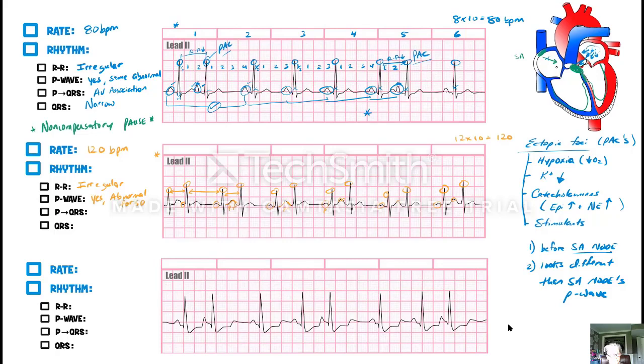That's definitely something that we know. All right. Can I for sure 100% say that this is definitely a PT fusion? No, but I'm pretty darn sure. I'd say I'm about 90 to 100% sure. The reason why is, again, that QRS complex is coming much, much earlier. So what does that mean to me? That means that the P wave from that ectopic focus within the atria fired before it was supposed to, and it fired at the end of repolarization. And again, it's riding on the shoulders of that T wave.